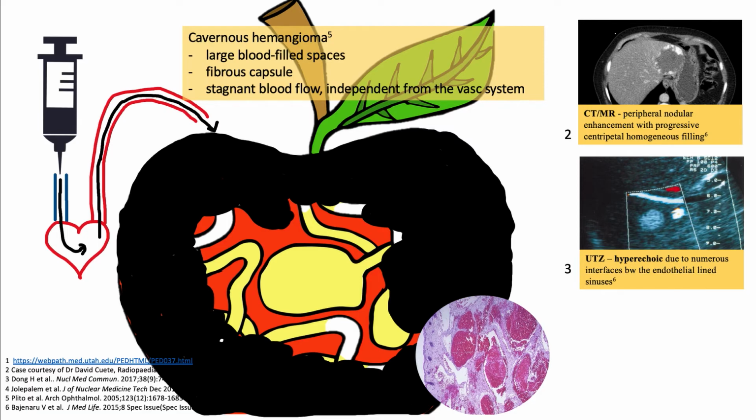Now, what about Doppler? Knowing that this is a vascular lesion, one might expect that there will be an intense color Doppler signal. But see here, there is no Doppler color signal. Why is this so? While the literature does not exactly say why, we can relate this lack of Doppler signal to this third pathologic finding here, this one.